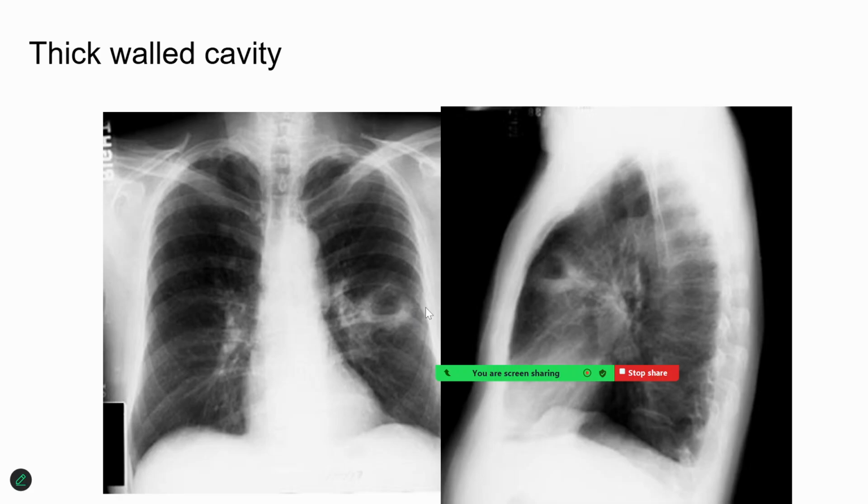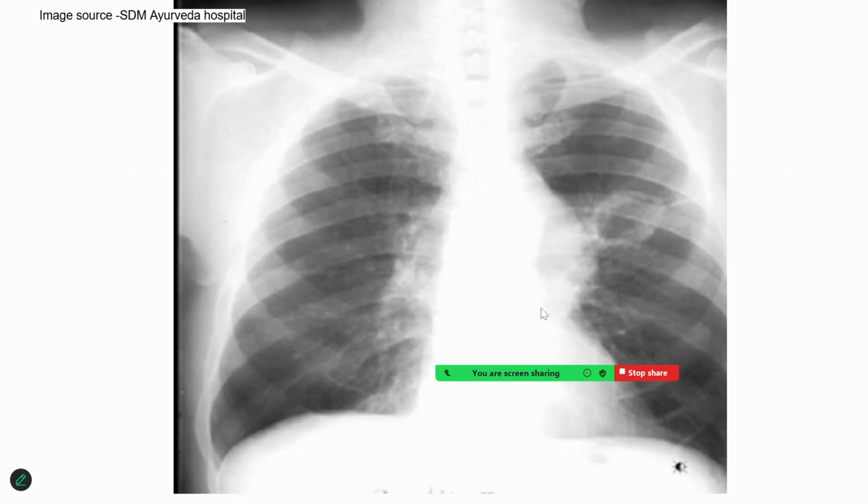Whenever there is such a suspicion, a lateral view X-ray can help you. Tuberculosis usually is limited to one segment, like the anterior or the posterior. In the lateral view, the lesion is limited to the anterior surface of the chest, and hence we may suspect it to be more of tubercular origin. Whereas a tumor pathology which may produce a cavity may involve both surfaces, and would be located somewhere in the middle of the lung tissue.